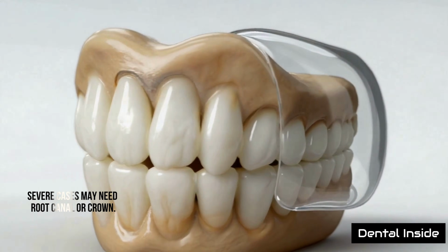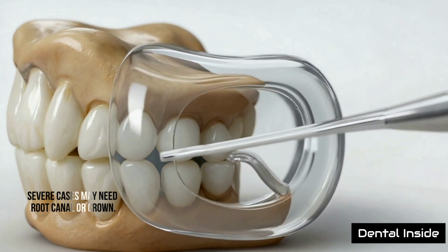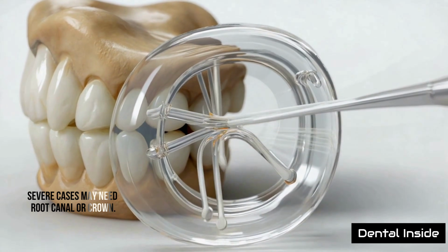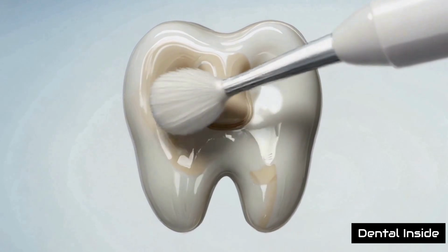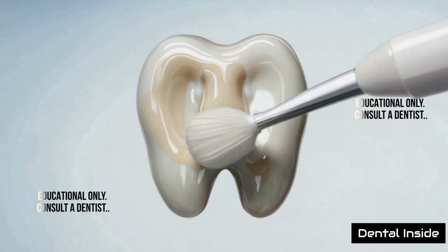If the pulp is infected, a root canal may be needed. If the tooth is too weak, a crown may protect it. Final polishing restores bite and smoothness.